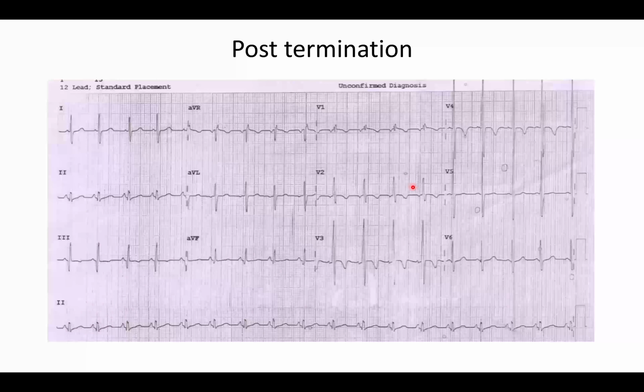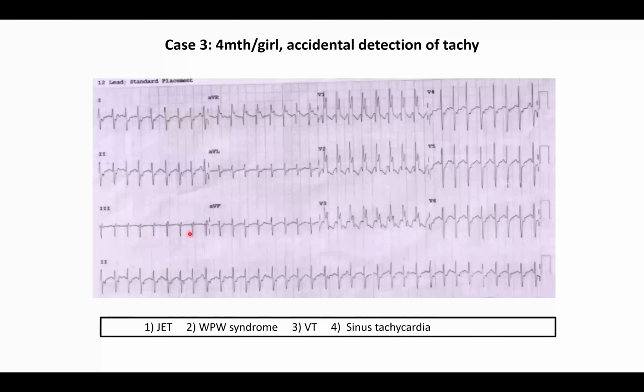It's very nice. Can you see the first R, the rabbit ear, has become smaller than the second? This is typical RBBB. That is one. And can you see now this R has become prominent. They may have T wave inversion for the first few years in the pediatric age group. But again, I'll go back just to teach. Can you see this negative? This first rabbit ear is bigger, and AV dissociation. So this is a ventricular tachycardia.